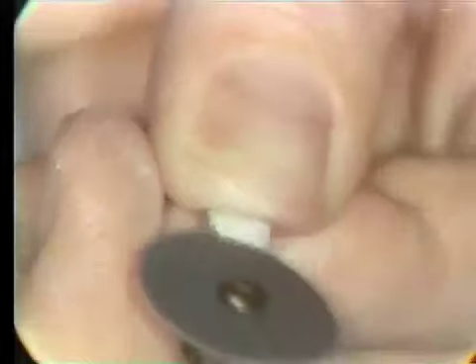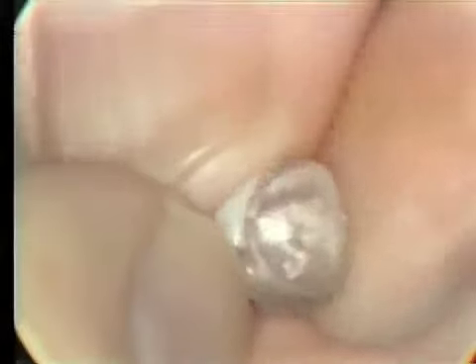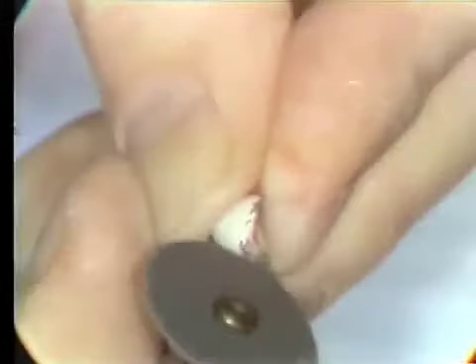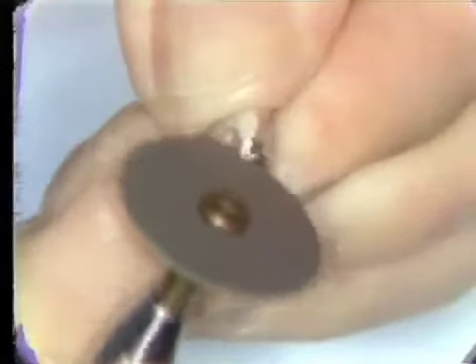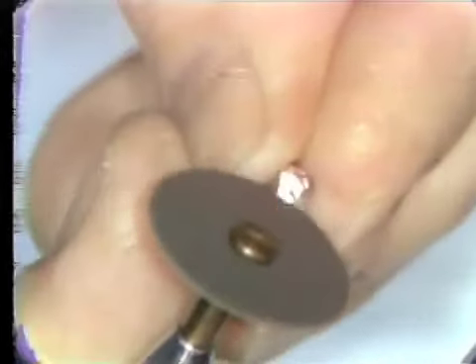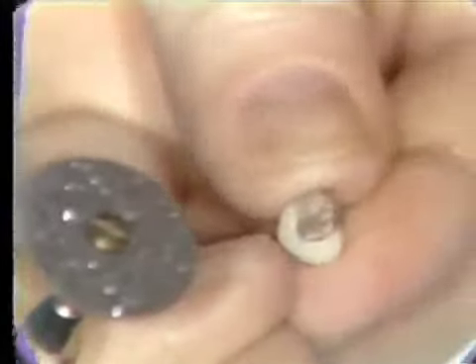In trimming the crown or contouring the crown, we want to make sure that we wind up with a concavity here on the proximal areas. Remember that we have a gingival papilla that needs to live in that area, so we would like to develop a concavity for that papilla. Also, we would like to cut down any over-contour, in this mouth particularly. She has a very sensitive gingival tissue that responds to the slightest bit of plaque, so we would want to eliminate any undercuts and have as self-cleansing an area as we can.